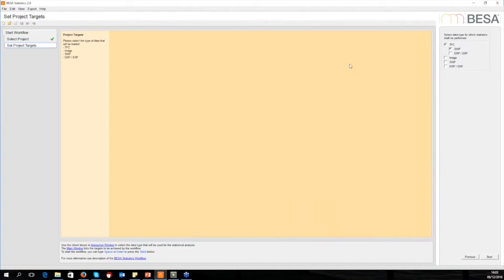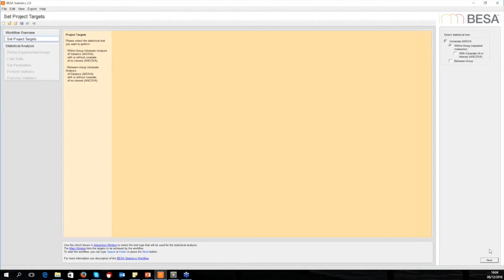I'm now interested in the auditory processing of more complex auditory stimuli. So the subject listened to in-tune chords, to out-of-tune chords, and to chords where just one of the chord components was delayed. There's a source model for the processing, and a time-frequency decomposition was done. So that means we need to select the data type as time-frequency source waveform and start the workflow for this.